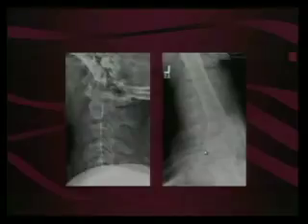Let me go to this so we see 2, 3, 4, 5 on the first lateral on the swimmer's view. You can see 2, 3, 4, 5, 6, 7, and C1. And there's a bony fragment. This one you can diagnose. What did you tell me is going on here? C6 is fractured. There's a fragment. Yes. And then it's also posteriorly subluxed.